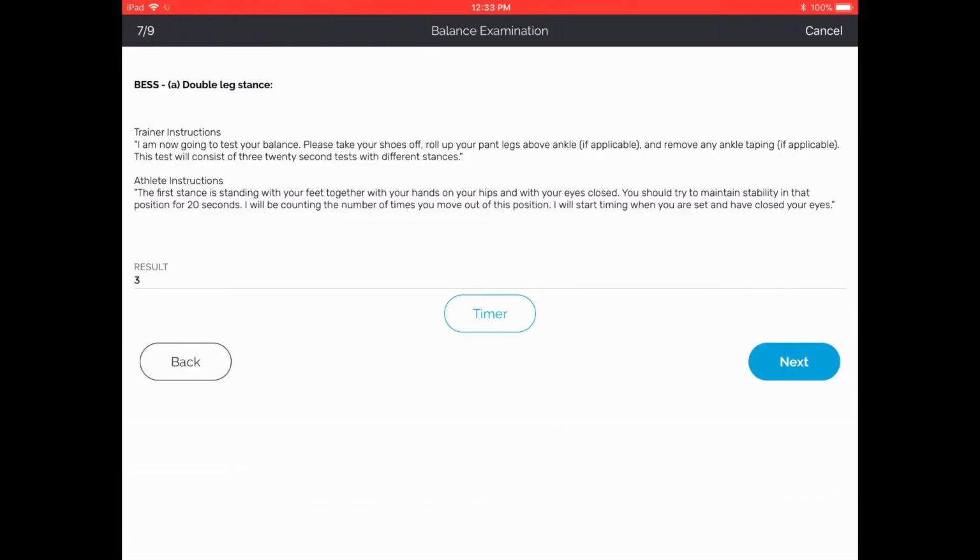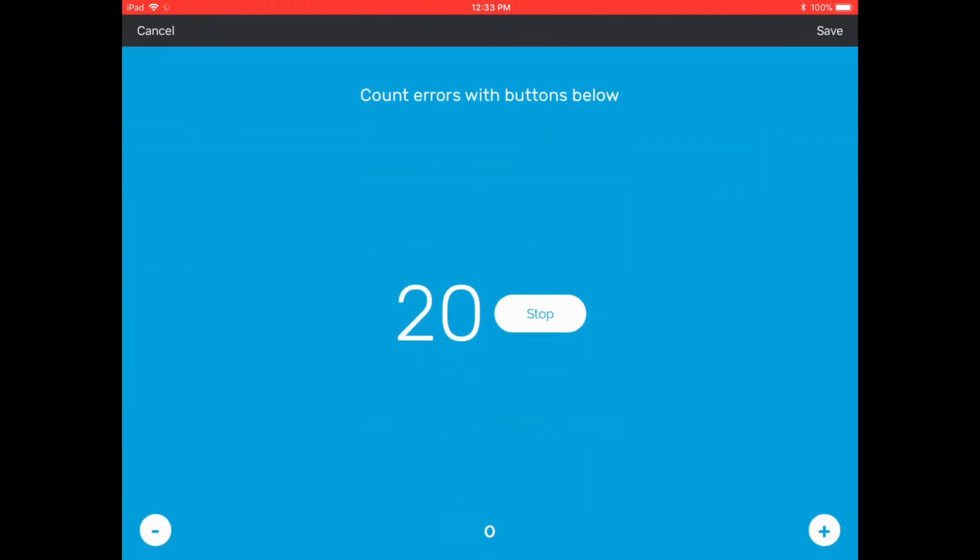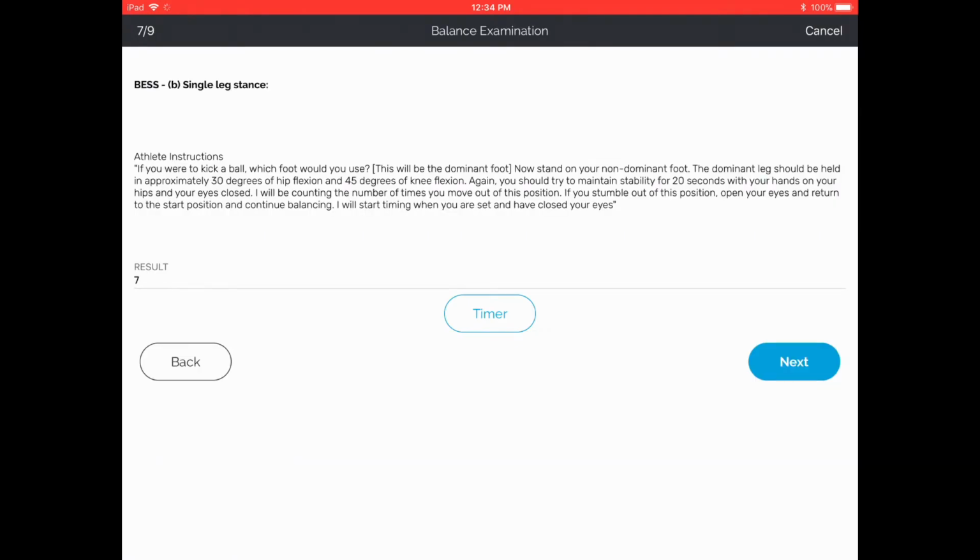See where the result number 3 is. You can change that number to a 4 or a 5 if you feel like you missed it. These buttons are extraordinarily beneficial. Keeps the time and your mistakes all in one place. Really easy to keep track of those.